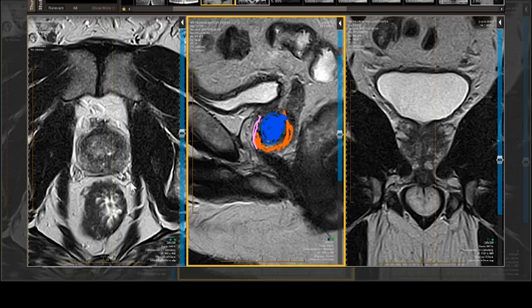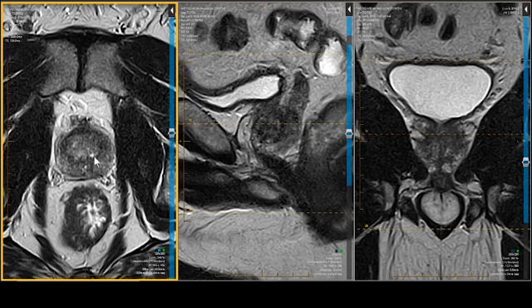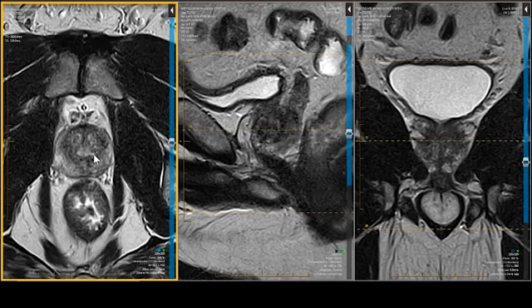Now, one of the reasons why we're showing this as a PIRADS 1 is there's very little heterogeneity within the transitional zone. It's pretty hard to find a PIRADS 1 because all adult males have some degree of nodularity in their prostate, in the TZ. And those nodules can be very bright or very gray, but they must be well encapsulated. Here we have just a little bit of heterogeneity, but not much. No encapsulated dominant nodules. Oh, there's a little dot there. Okay, we'll write that off.